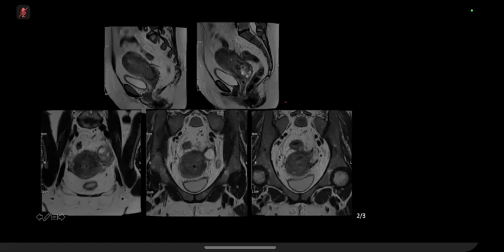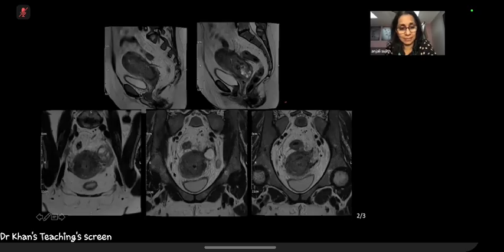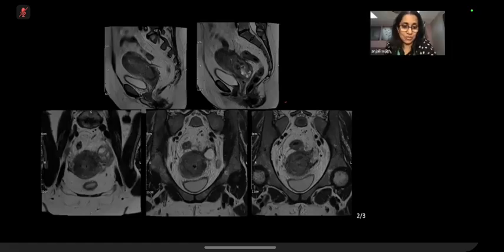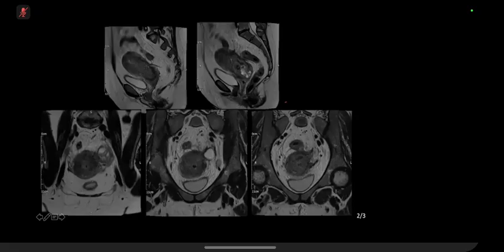Okay, so I can't distinctly make out the endometrium from the myometrium or the junctional zone. And on the axial images, there's a lot of stranding around the uterus. What does the stranding mean? I think if I'm suspicious that there's a big endometrial mass, then these would be suspicious of serosal invasion. Good, parametrial invasion. So when there is adjacent fat stranding, it's crossed the serosa and it's going into the parametrium. Good. And what am I pointing at? A lymph node? There's an enlarged lymph node there.